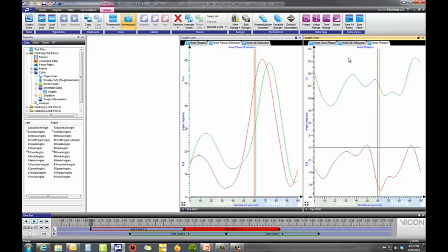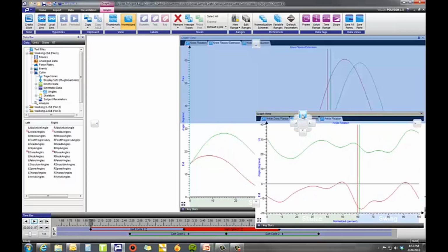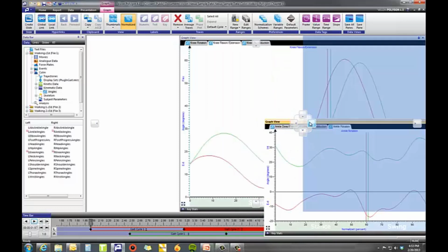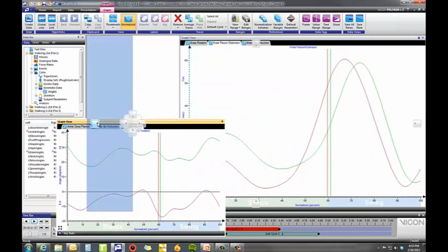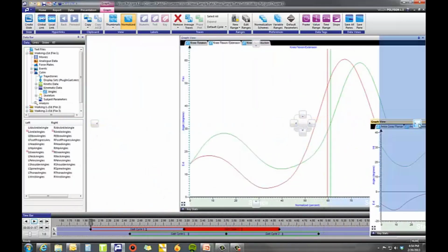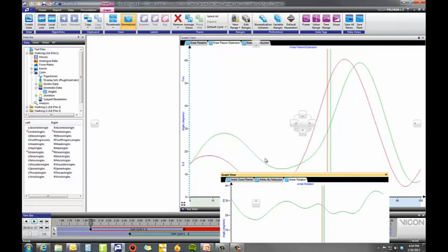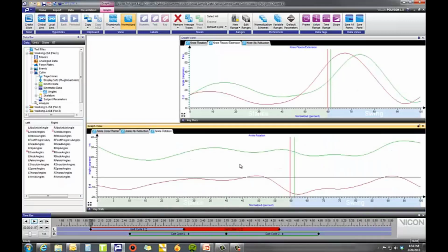So now I've got both of those in there, and if I would like to reorganize them, I can grab a hold of this one and begin to move. That arrow does pop up, so if I hovered here, it would fill half of the graph view, or the bottom half of the graph view, the left half of that graph view, or the right. Or I can go to the big ones, and then it'll fill the top half of my whole screen, or just the left half of the remaining space, the right half of remaining space, or the bottom. It is trying to accommodate the other graphs that I have in there, which is why it does seem kind of sporadic in its positioning.